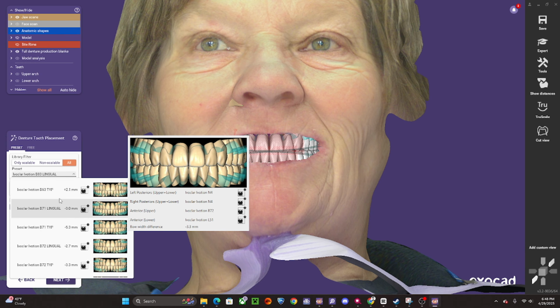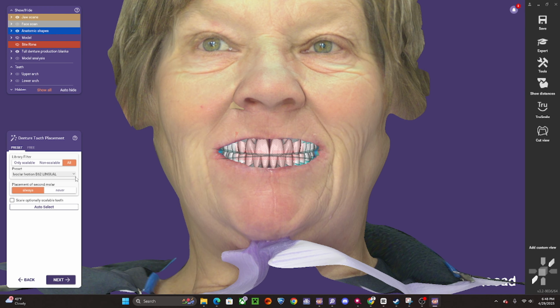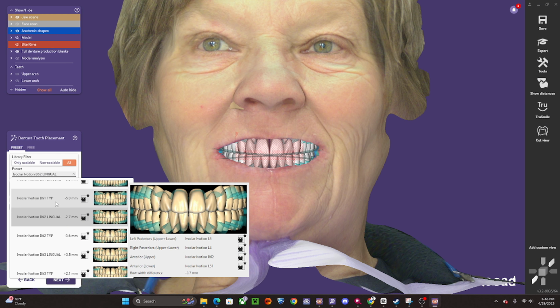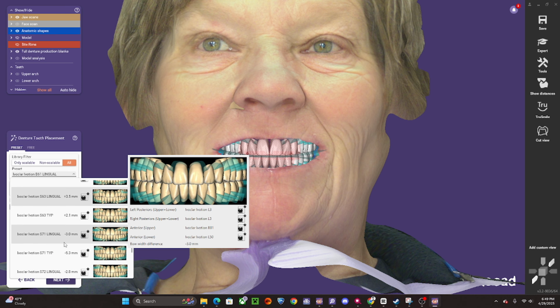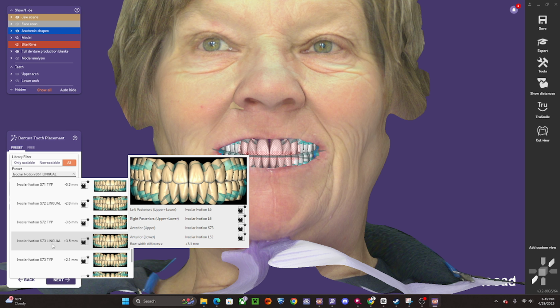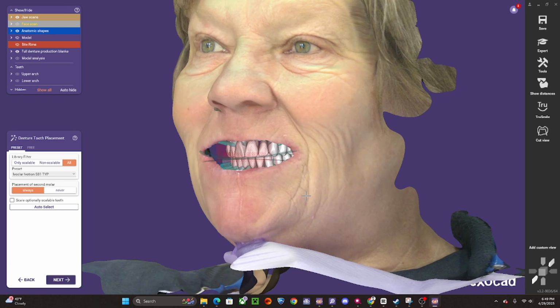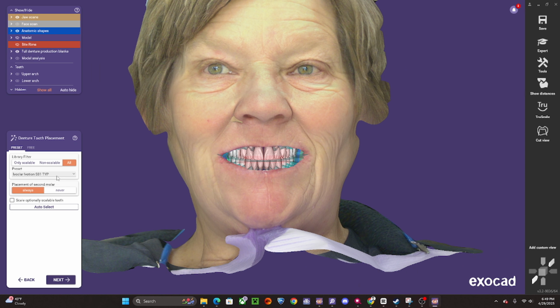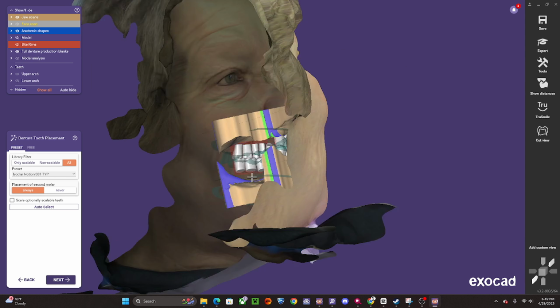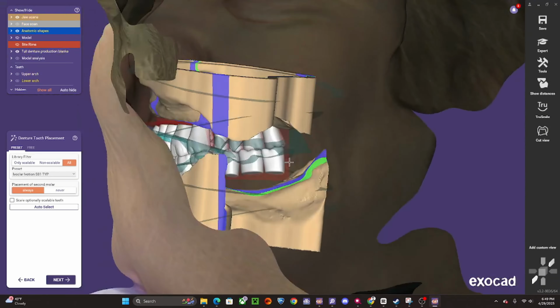We also have the B71s, B62s. 62 has more rounded, but not as rounded as our S70s and 80s. We can stick with the S70s and 80s. This should fit this patient. Let's do S81 maybe, but I am going to verify that it's on the ridge appropriately.